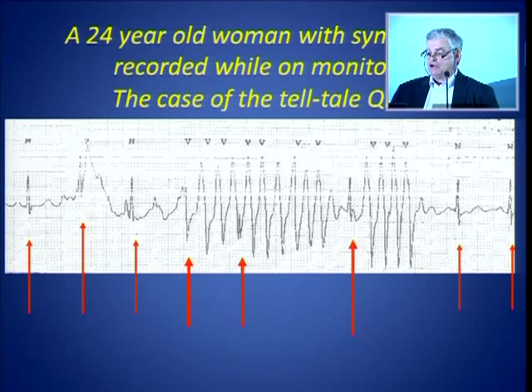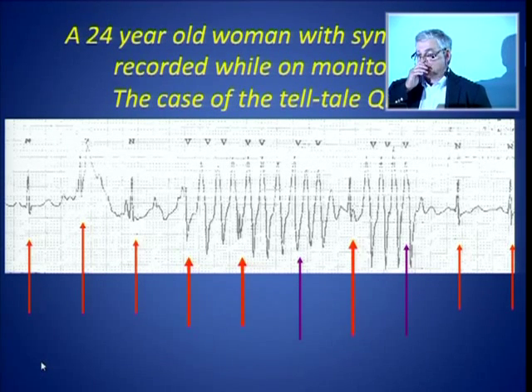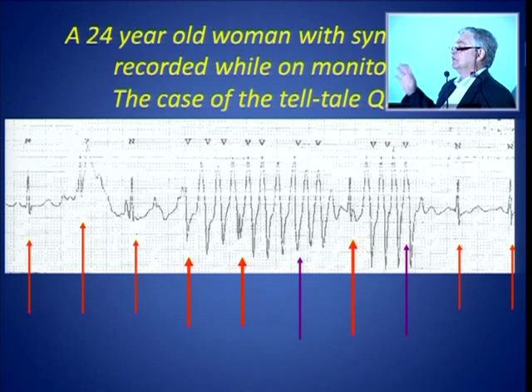And there's our RR intervals based on this. And this fits exactly with twice this, so there's probably a QRS right here. There's certainly one there, we can see it. And so we have a couple of question marks there, and those are almost certainly sinus QRSs there.